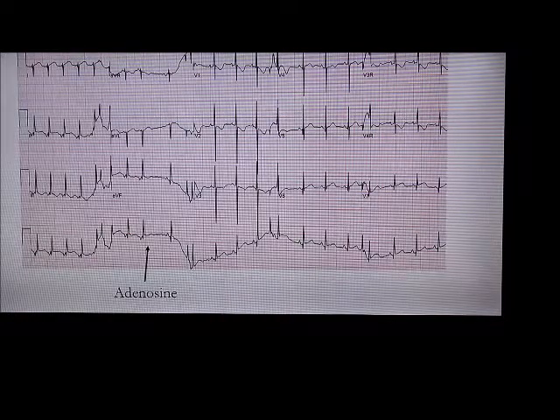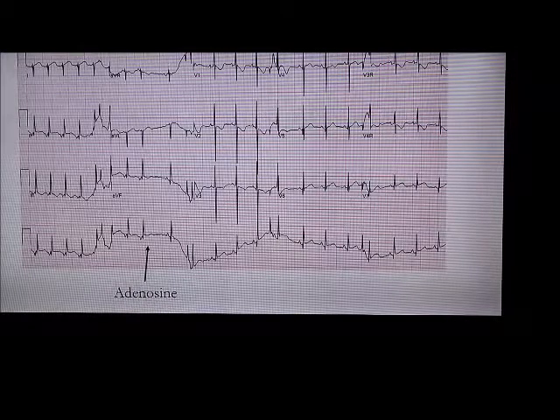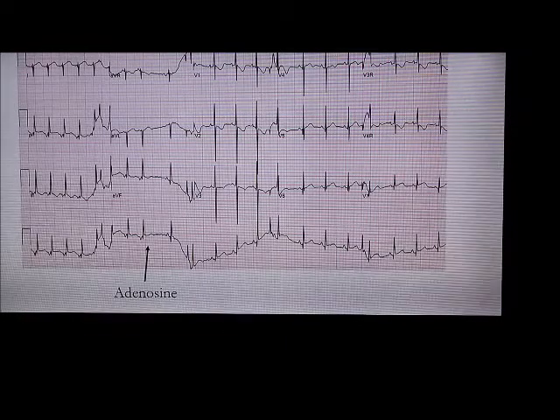So this is the tachycardia I want you to comment on, and then once you finish that, tell me what happens when we give adenosine. Okay, again narrow complex tachycardia. Okay. So all your analysis is based on this section, tamam? Not this section. Long RP.